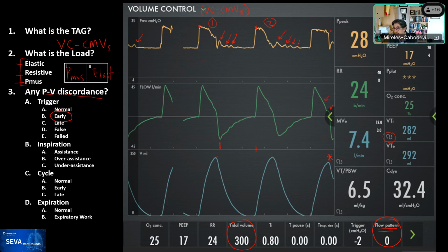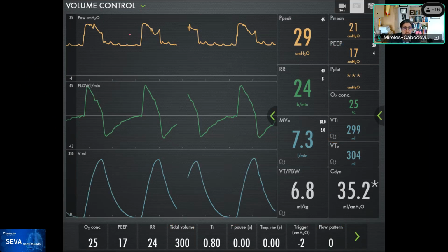And just so that you get excited about it, I'm going to show you the next waveform. This is the same patient. You can see your early trigger, and now the early trigger is very evident, right? You see the varying heights, but it's definitely an early trigger. But here are the little humps that you see. So what's causing this? Have no fear, put the cause.